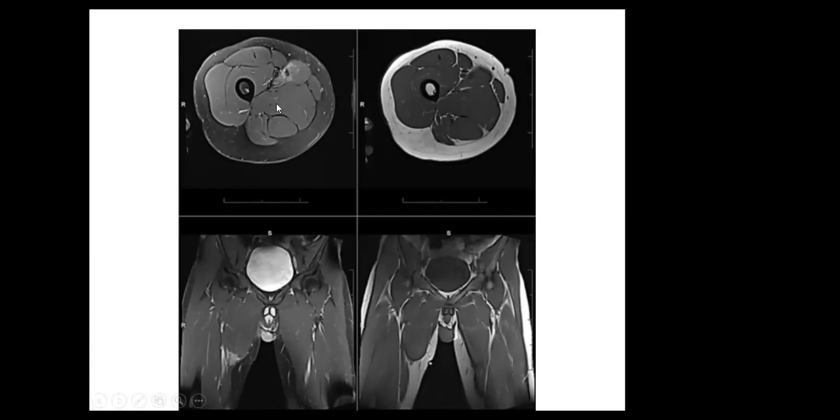Now let's move on to the pathology. Which muscle is this one? I think he said adductor magnus. Yes, looks medial, the medial muscle group. Okay, so if this one is adductor magnus, then what is the name of this muscle? This will be the hamstring, we said it is posterior. This is the hamstring here. Okay, so this is the intermuscular fat plane.